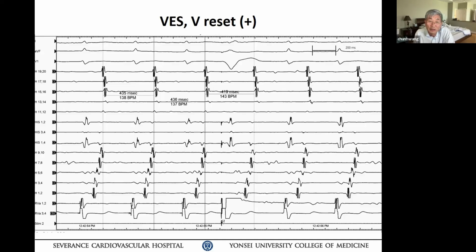I could be wrong, but I suggest you measure. Okay? That would be very helpful because his bundle activation is going to be only common antegrade conduction in this patient. All right? And then also, if you look again after the PVC, there's a slight V activation change coming and going. So look at the next slide.